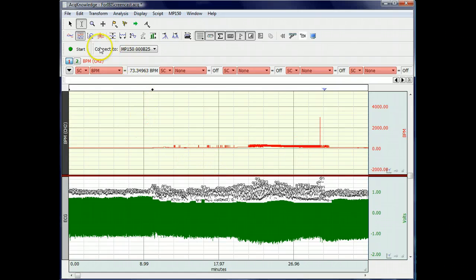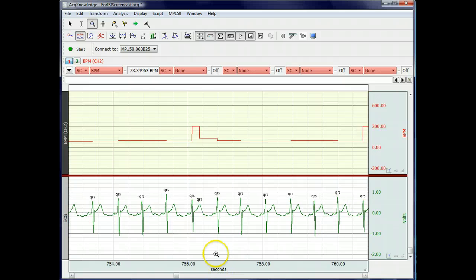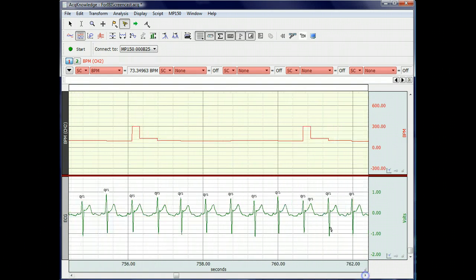And what you can do at this point then is just zoom in on places where there is a spike in that channel, and you can see this is the reason for that one. Now we want to quickly remove any extra events like that. Okay, what I'm going to do is watch the channel up here so you can see where there's additional spikes. You quickly see there, and then you glance down here to see what it is that's causing it.